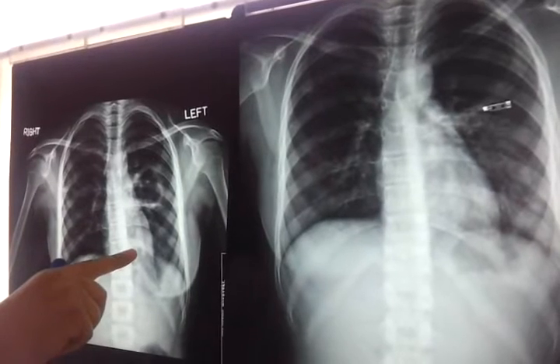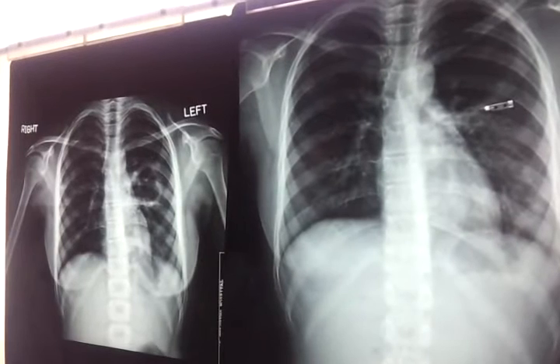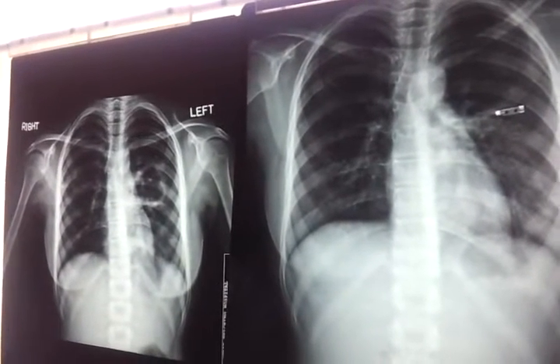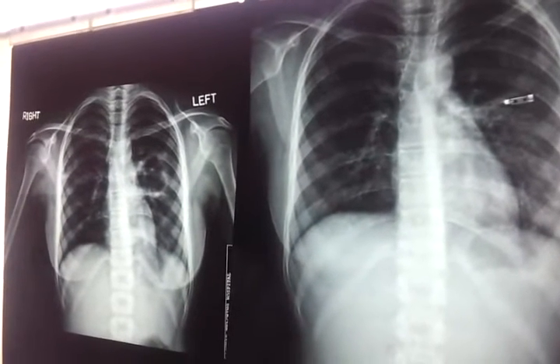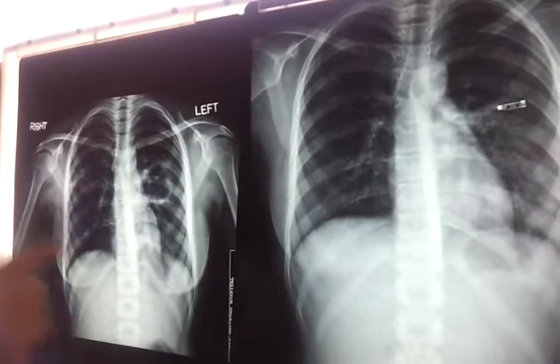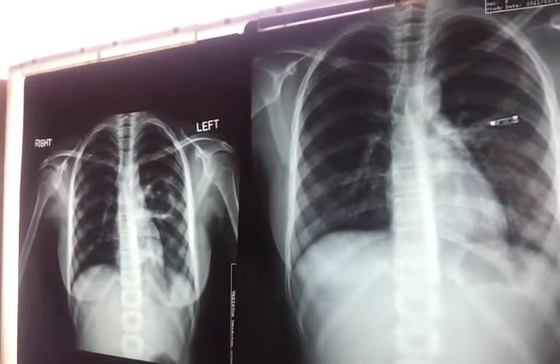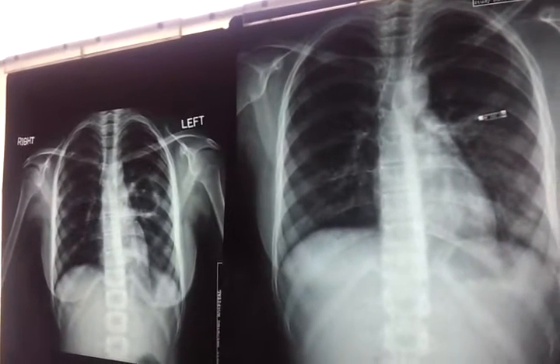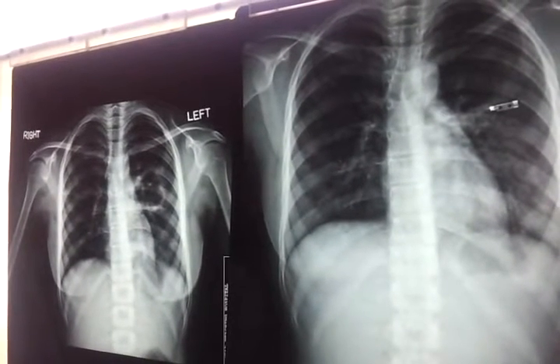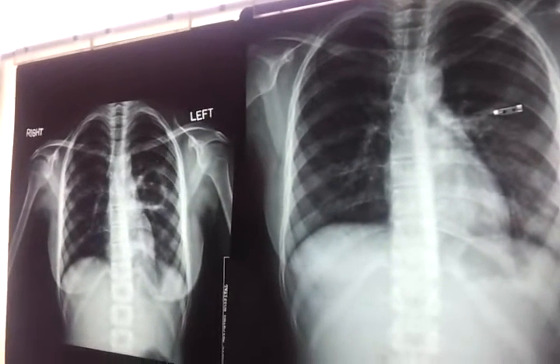But in post-primary tuberculosis, usually the immunity is what is low. The age of this patient is 11 or 12. This patient is 11-year-old with this cavity. She had actually a family history of tuberculosis. She had contact with tuberculosis. A female, an elderly female with diabetes and had tuberculosis, and she got tuberculosis from her grandmother.